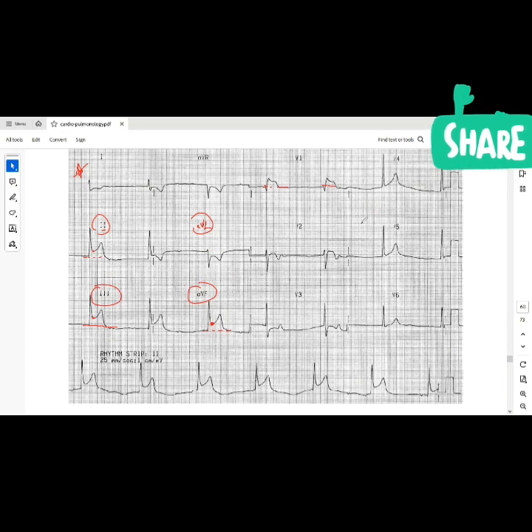Okay, let me rephrase that. Leads 2, 3, and aVF have ST elevation. What does that tell me? What's going on? What conclusion can I draw from that? There's a transmural infarction of which wall of the heart?